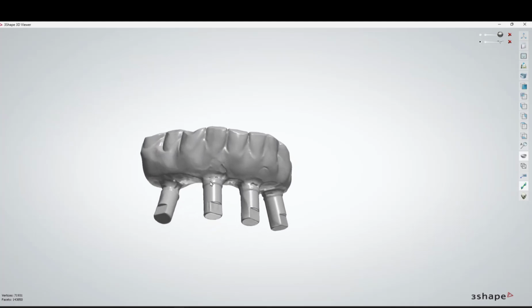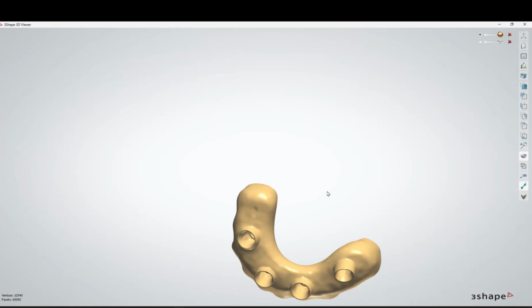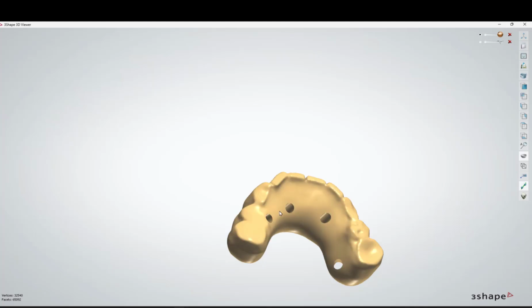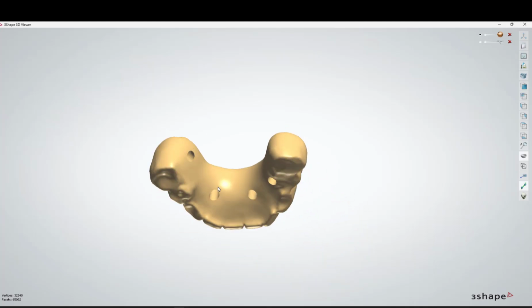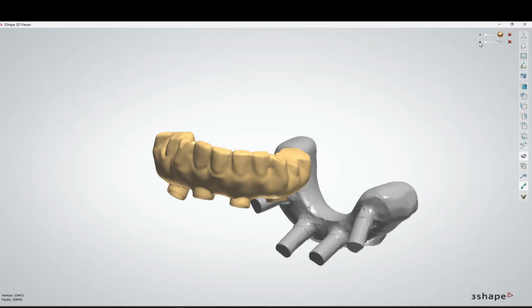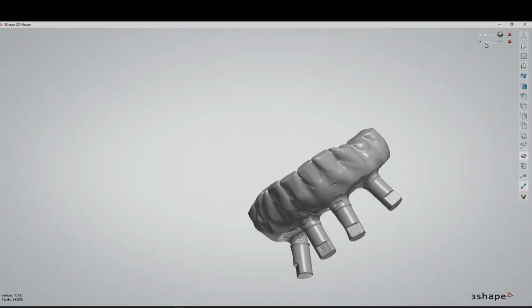So this was scanned in with the Scanalogs from Dynamic Abutment, and we want to turn this file into this file here. Something that we can print out that has new screw channels that are nice and clean. It's a solid piece and we can fit titanium bases into the bottom. So I'm going to walk you through the two workflows that you're going to need to accomplish this. We'll also discuss how you can set up and redesign your case if you wanted to just use this scan as a model and then design a fresh case on top of it.